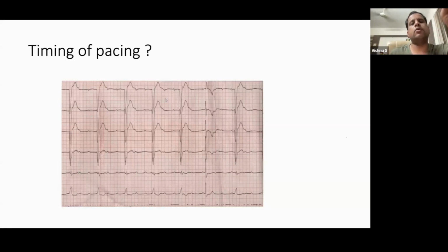That is the one. In a patient with complete heart block, the first thing you have to look for is the QRS morphology. If it is narrow, they may have a stable junctional escape. A bundle branch escape like LBB or RBB is an unstable escape. That should tell you the patient will have problems. A high atrial rate also makes the patient symptomatic, indicating distress, along with the broad QRS escape.